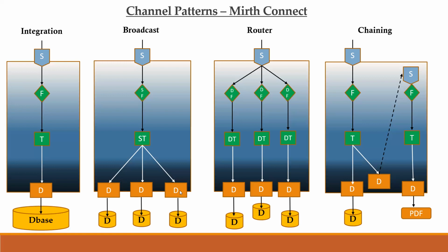Okay, and in the third case, if you're writing the data to, let's say, a database directly, in that case you don't need to explicitly get a validation response from the DB because you have access to the DB directly. And if something goes wrong, the channel itself will shoot up an error stating that it is unable to write the data to the database. So it purely depends on the various connection models that we have. Okay, does it answer your question? Yes. Thank you. No problem. Any other questions from anyone?